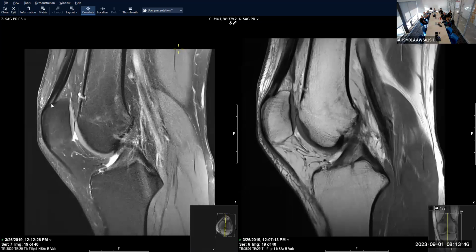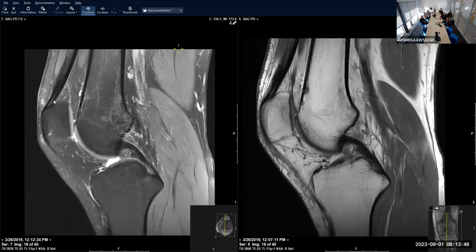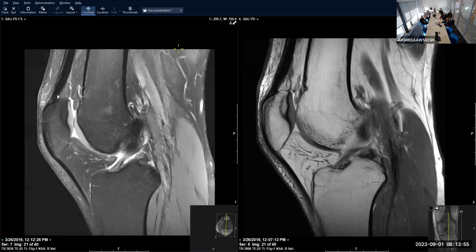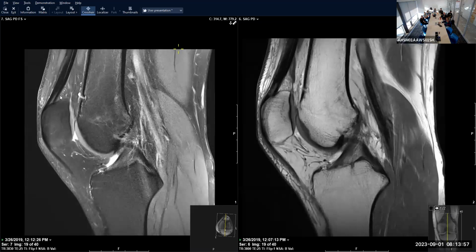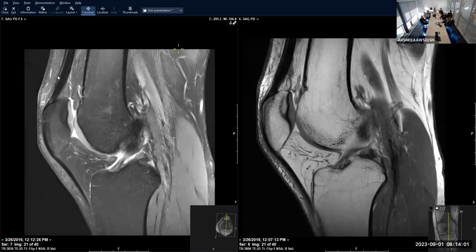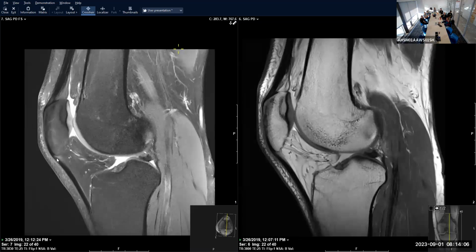Quad is going to look like this. It's got 4 tendon contributions, right? Vastus medialis, intermedius, lateralis, and rectus femoris. So it's got this multi-laminar insertion, and it's not always indicative of tendinosis. Most commonly, it's not. It mostly just looks like this. Maybe there's some proximal patellar tendinosis.